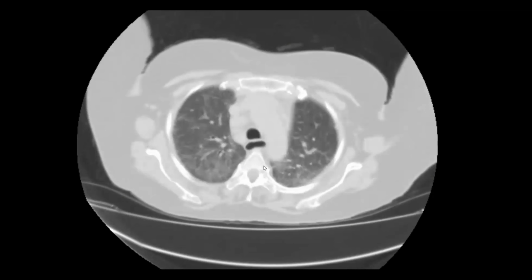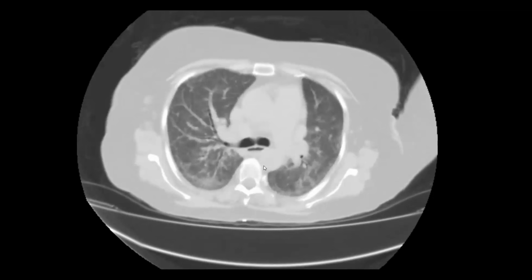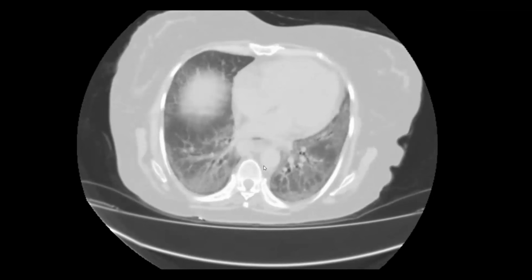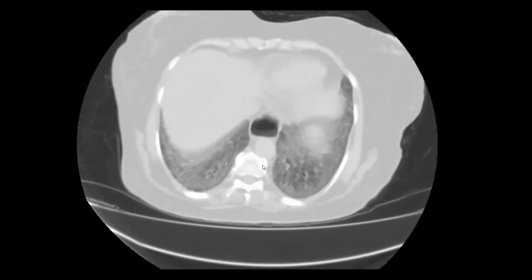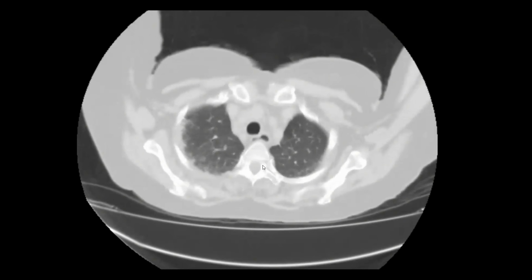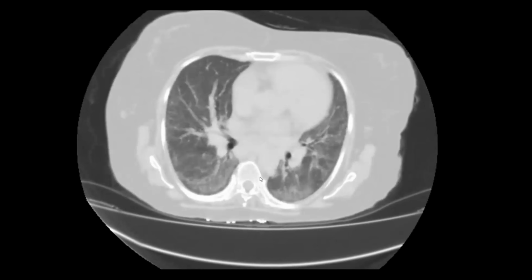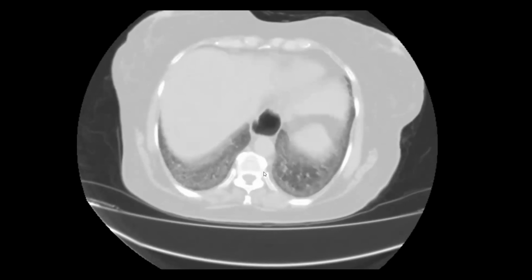Okay, these are CT scan axial sections, a lung window. I can appreciate that there are patchy areas of ground glass haze involving both lung fields, with interlobular septal thickening. I cannot appreciate any evidence of honeycombing within these sequences. There is no honeycombing seen, so findings are likely suggestive of non-specific interstitial pneumonia.